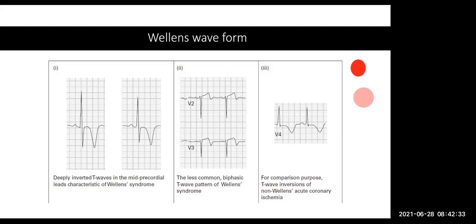The problem is this is very volatile, extremely volatile. In the next hour or two, they're just simply going to go back to that, and die. That's the sad part, okay? So in other words, be careful of the patient who has had pain, now is pain-free, but is presenting with these types of T waves, okay?